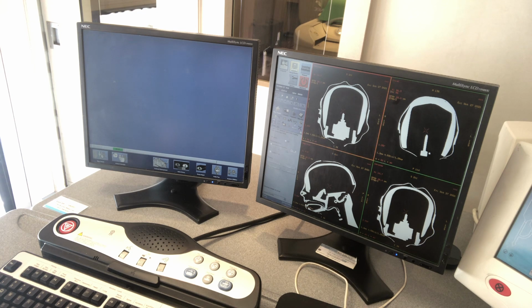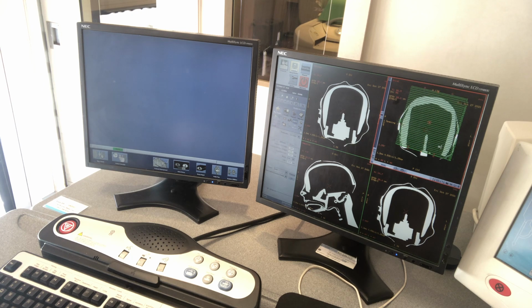Over here to the left, you're going to click batch, and it pops up with these green little lines and bars. Now your numbers on the side mean that you are fixing to work with your coronals. You'll have some red arrows up top and a red dot in the middle. And then there's a red square in the middle. You move the red square to the center of your image, and then you extend with the red arrows.